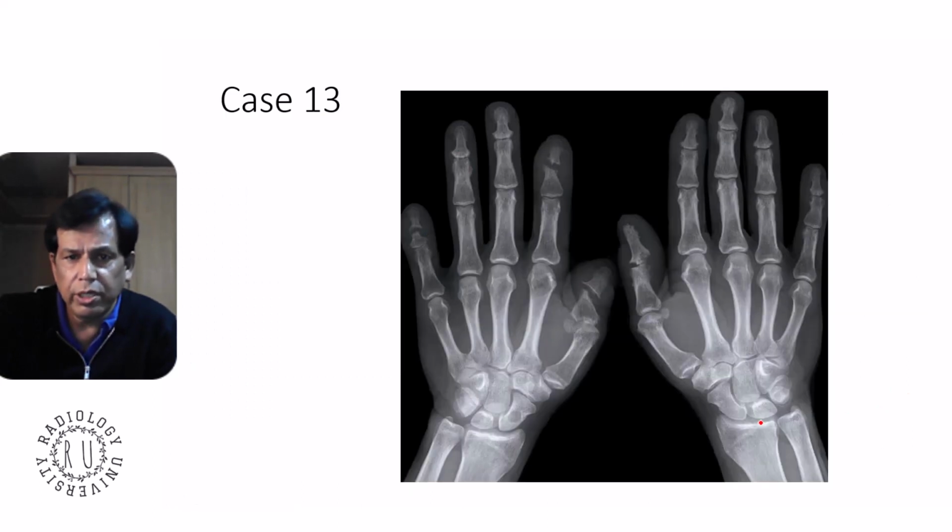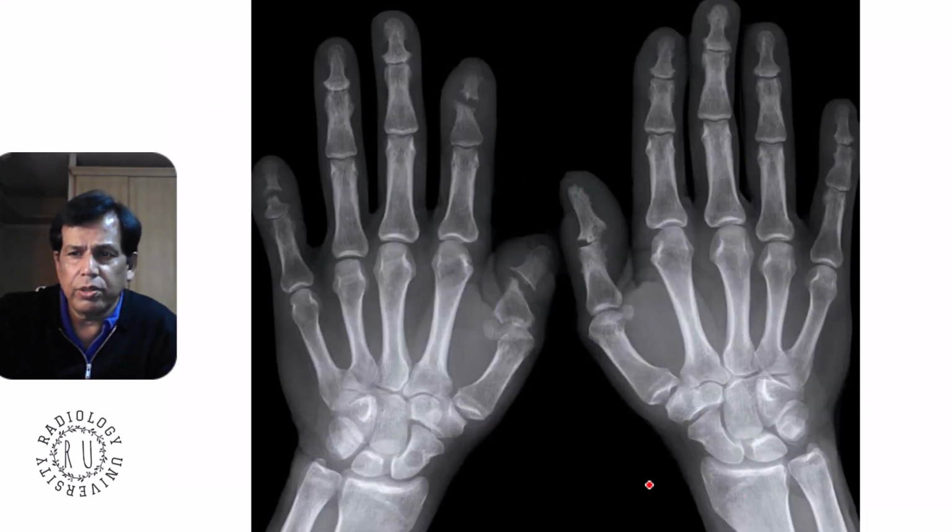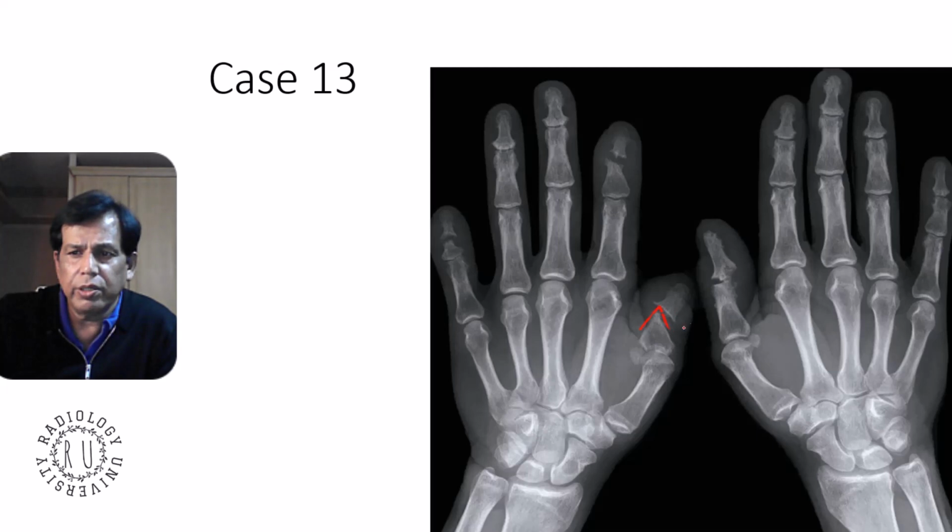Case 13. Have a look at this one. Look at this joint, this joint. Asymmetrical, first of all.